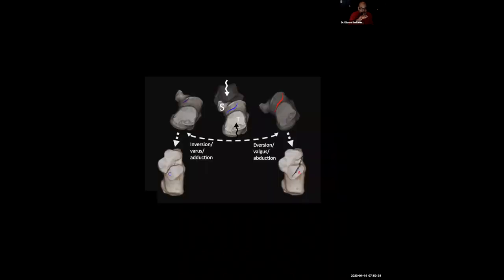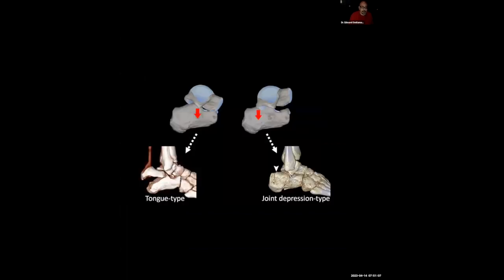Okay. Now let's layer on a couple more things to better understand these intra-articular fractures. Depending on how the foot is inverted or adducted, or everted, valgus or abducted, that's going to help dictate where these primary fracture lines occur. That is, more centrally or medially towards the sustentaculum tali, or laterally towards the lateral aspect of the calcaneus here, okay? And I label these A and C, but this is going to make more sense in a bit with the Sanders classification, okay?